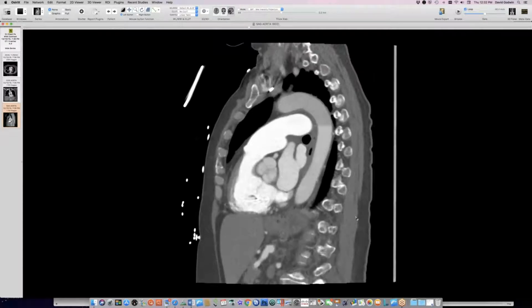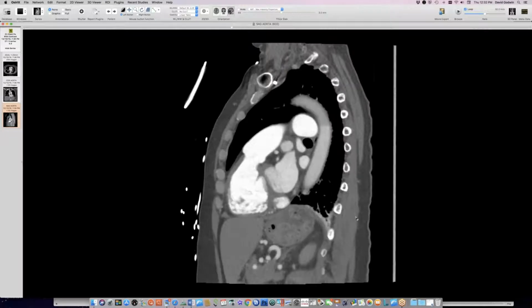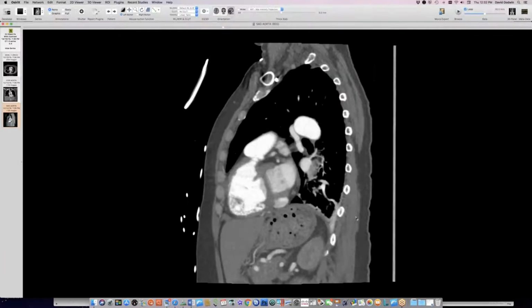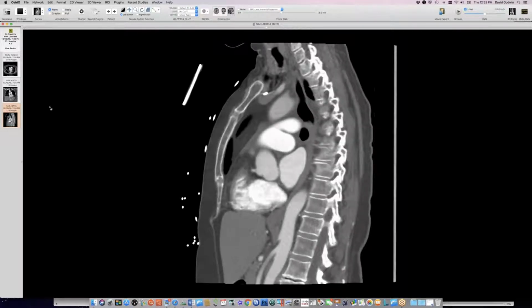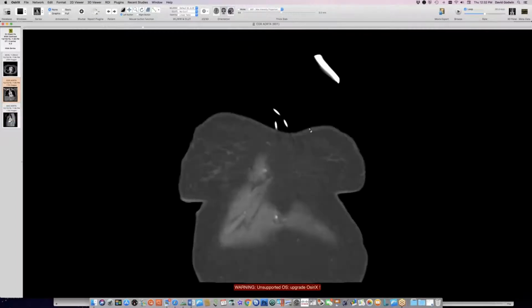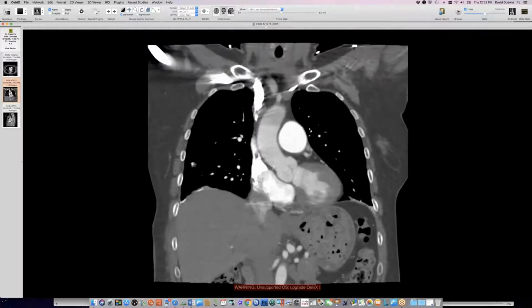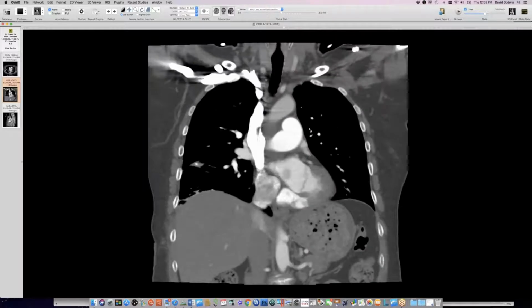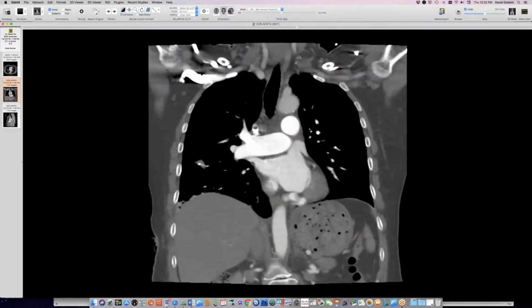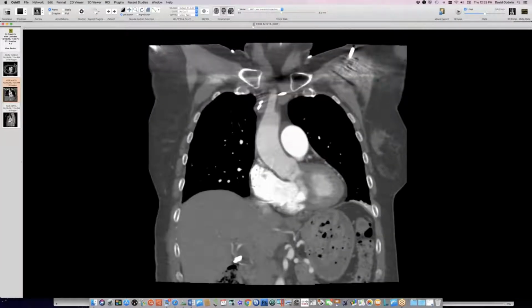My guess is it probably has to do with the severely elevated right atrial pressures, given the fact that the guy has a pretty hypertrophied and dilated right ventricle. The coronary sinus is relatively low pressure, like the right atrium. So if the right atrium is dilated, I wouldn't be surprised in cases of bad pulmonary hypertension if you get some weird coronary sinus appearances. But I agree, it's definitely bulbous. I've seen cases like that where you have stenosis of the Thebesian valve, which is the valve that connects the coronary sinus to the right atrium. But again, that would be hard to see on a PE study.